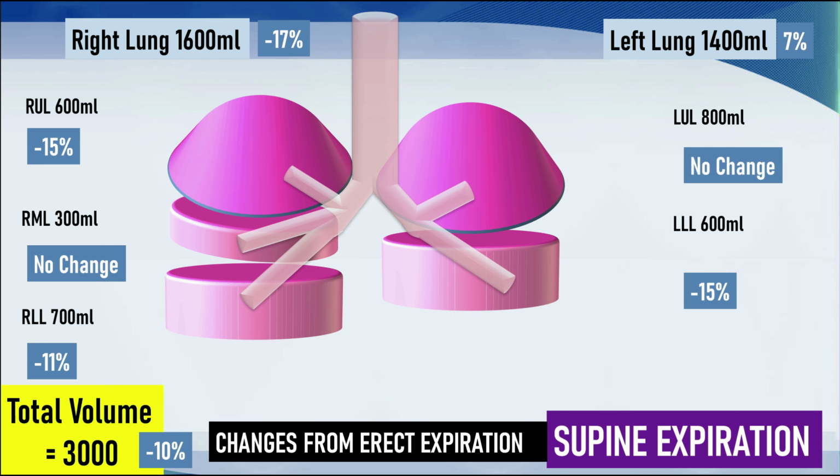So if you have a patient lying flat in the bed, they're in exhalation and an x-ray is taken, this can be really misleading because it looks like they've a dramatic loss of lung volume. They're just in expiration. So we always try and take x-rays with the patient sitting up in the bed, holding their breath or having their breath held for them, being as erect as possible.